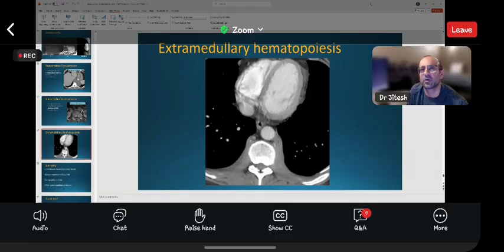Yeah, that's a good question. Thymolipomas, as I mentioned, usually conform to the shape of the thymus, and you see predominantly fat with some soft tissue. In lipomatosis, the fat is very soft, like brown fat. It insinuates between the structures, so it's not a discrete, encapsulated lesion like a thymolipoma. Lipomatosis is an insinuation of fat in between these structures. That's how you differentiate.